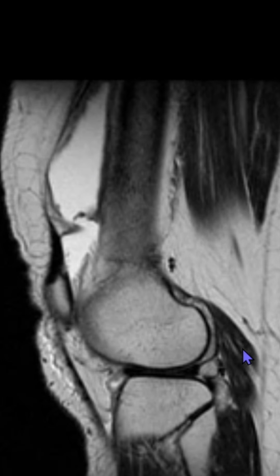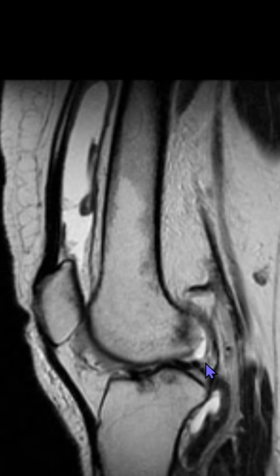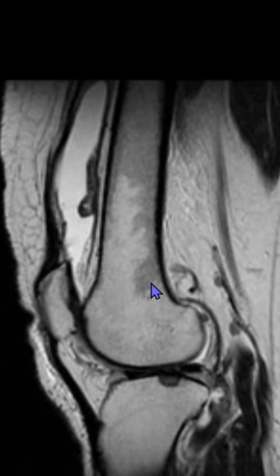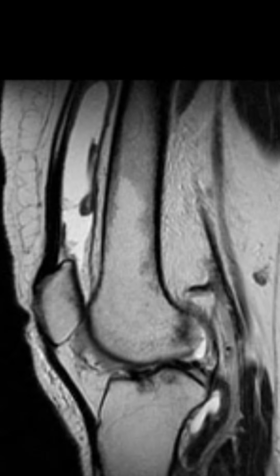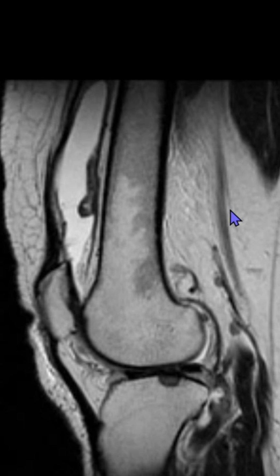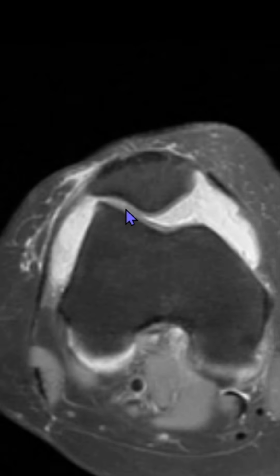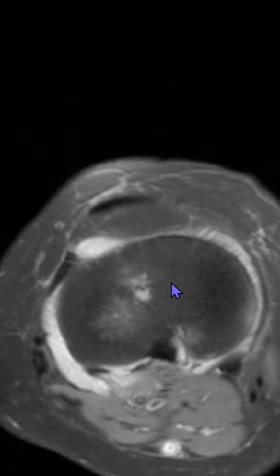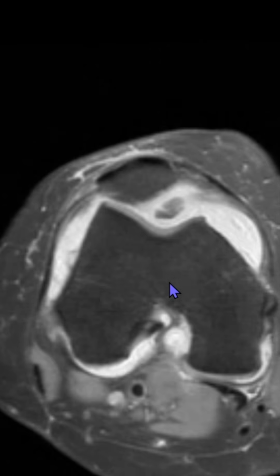But when we see that the amount of joint fluid is way more than what the degenerative changes should be associated with, and there is significant synovial thickening, we should definitely think of primary inflammatory pathology. And also we have got a few lymph nodes. If the amount of lymph nodes was more, or if the amount of periarticular soft tissue edema was more, then we should have thought that this is a kind of septic arthritis rather than an inflammatory arthritis.